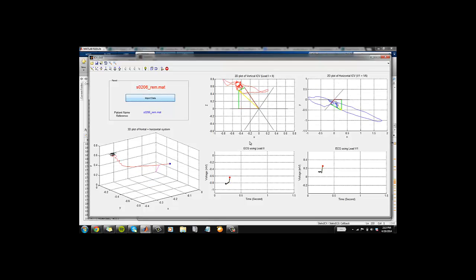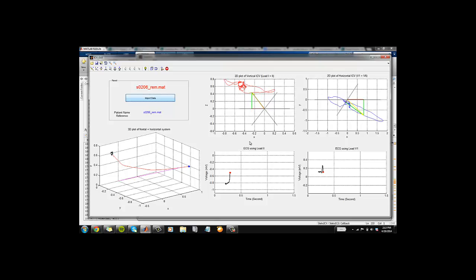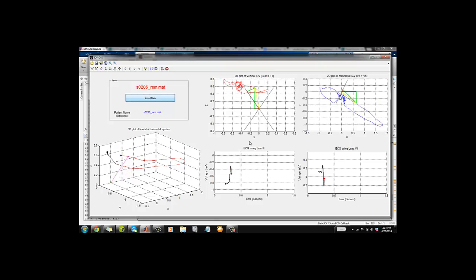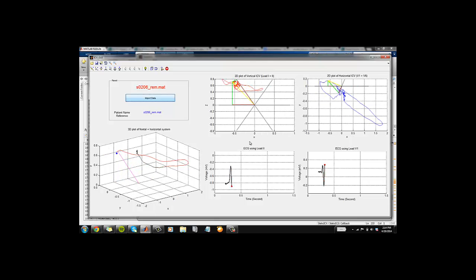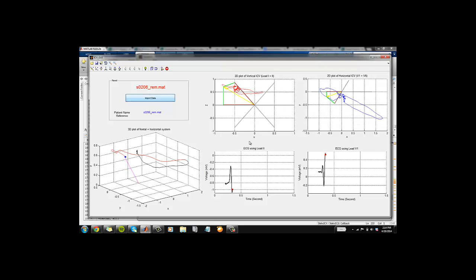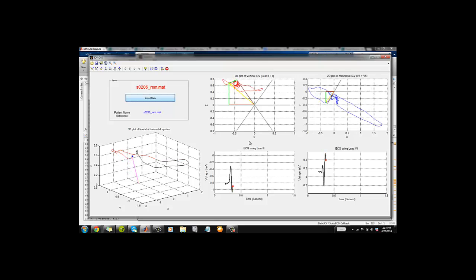The dynamic construction is a bit slow due to the amount of memory that the plot3 function uses when plotting the curve. But this may be remedied with the use of a system with greater RAM capacity. Physicians will find utility in a program such as this for constructing 3D ICVs in real time. The utility of having 3D ICVs is discussed in detail in our manuscript.